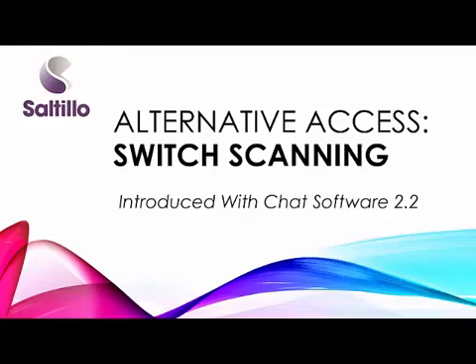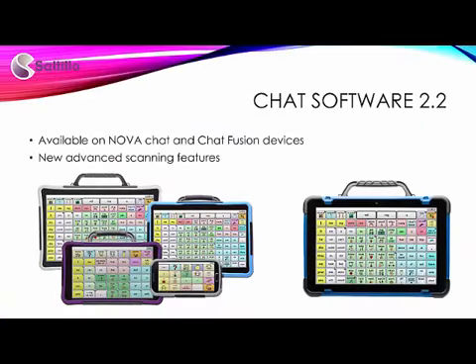This tutorial will explore the scanning features and settings available in version 2.2 and higher of the chat software. Chat software is found on the Saltillo NovaChats and Chat Fusion devices. The features I will explore are developed specifically for individuals using switch scanning as their alternative access method to communication.